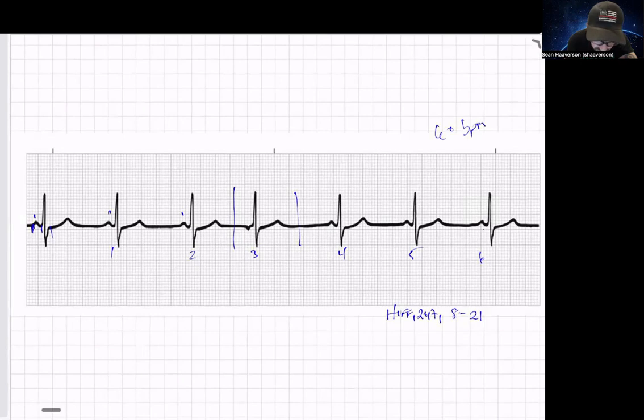Okay, so that looks like we've got 0.12 on our PR interval. Our QRS looks like we're at 0.1 or so. Let's see. I'm not sure it'll qualify with our J point. I don't really feel like that's going to qualify as depression.